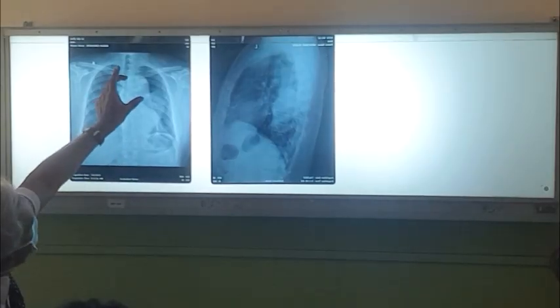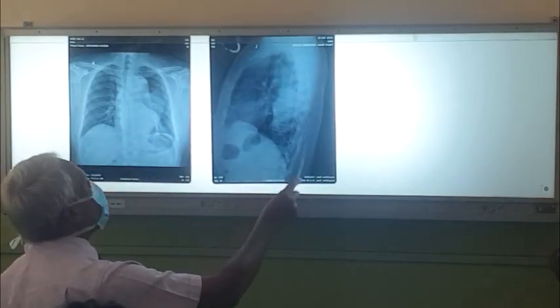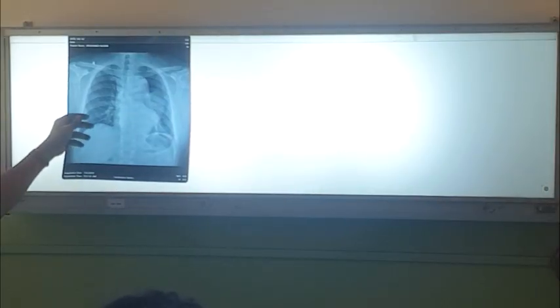So this is a very big aorta, and from here it is going like this. So bulging, leaking aortic aneurysm. So this is a leaking aortic aneurysm here. So in its CT it was leaking and bulging, dissecting aortic aneurysm. So history is very important.